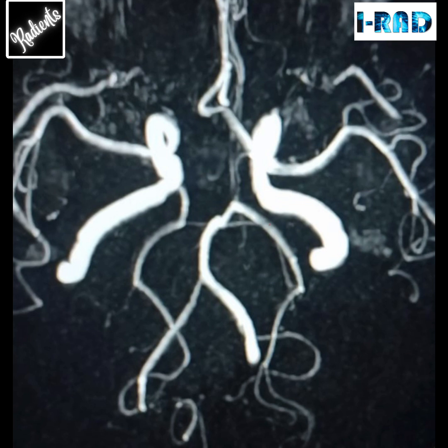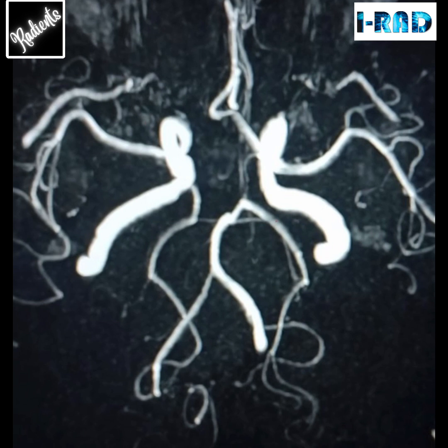In our previous post, we asked you to answer this question for us. And the question was, if we look here, we can see that this is the MR angiography of the circle of Willis. And we asked you to name two anomalies, or rather two variant anatomies, that are present here. So we are going to discuss those variant anatomical conditions. For that, we will first have to have an idea about what these structures are.